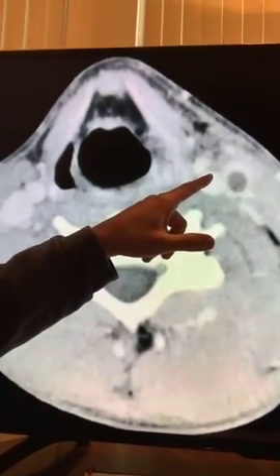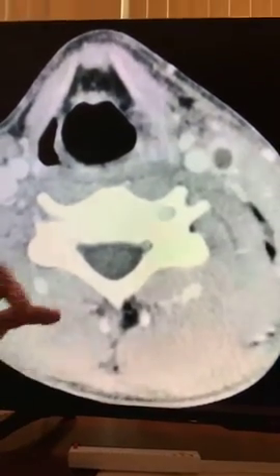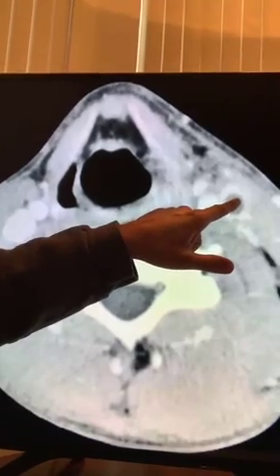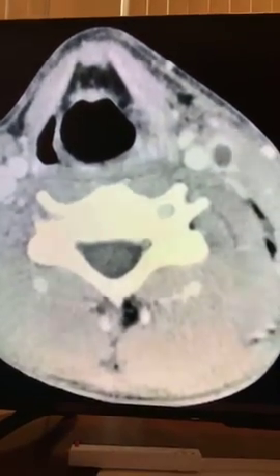You can kind of see maybe there's some contrast around it. Maybe that's the enhancing wall of the vessel. But there's something around it that's kind of enhancing, and then there's just a little dot of no enhancement in the middle. So we know that the internal jugular vein on this contrast-enhanced CT scan of the neck is thrombosed. So there's a clot in there, all right?